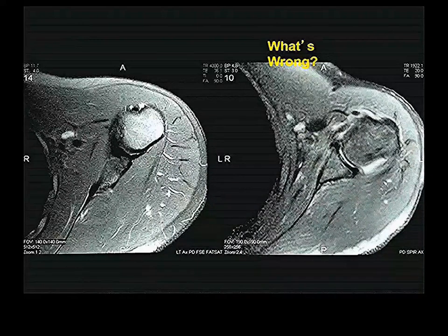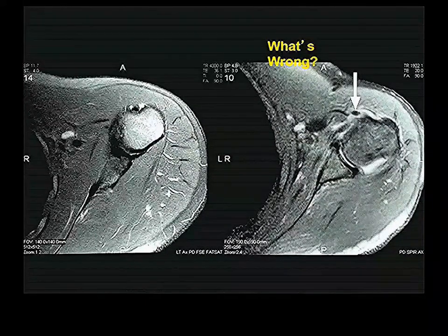Tendon of the long-headed biceps, displaced from where it should be? Very good. The tendon of the long head of the bicep is supposed to be sitting right there in that groove between the lesser and greater tubercle. It's sitting here, medial to the lesser tubercle.